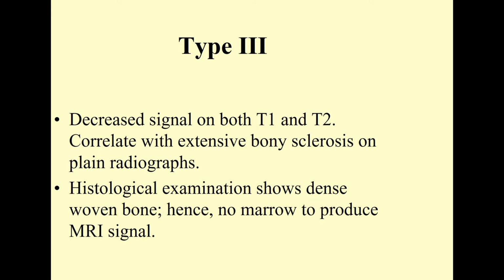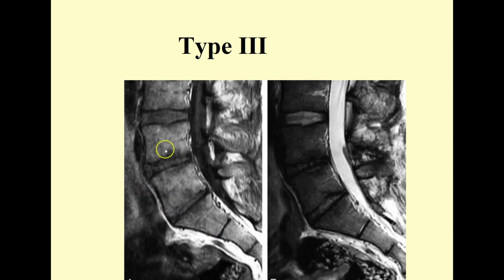As we increase the bone density in the region, we're going to see less and less mobile hydrogen. We're going to displace marrow, and it will impact the resulting MRI image. So here we have, again, at two levels, really L4 and L5, these little zones of decreased signal, a little thicker zone here. Again, a thicker zone of reduced signal here. And when we take a look at the T2 weighted image, again, we've got this thicker decreased zone here and up here and up here, all of it telling us that there's dense bone in that location.